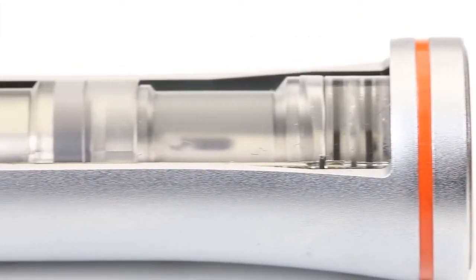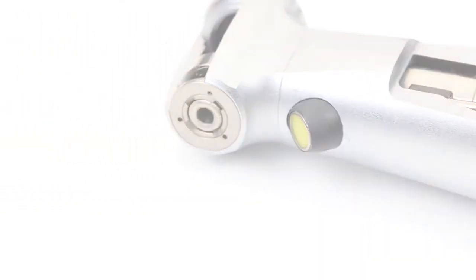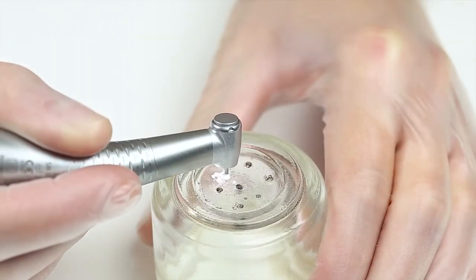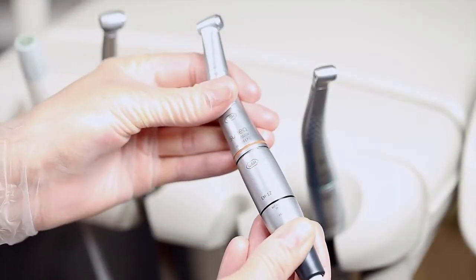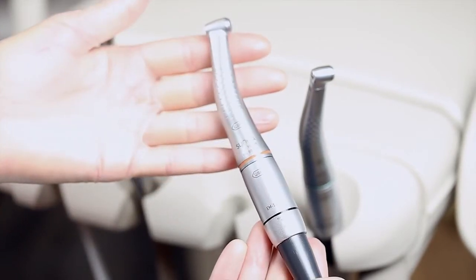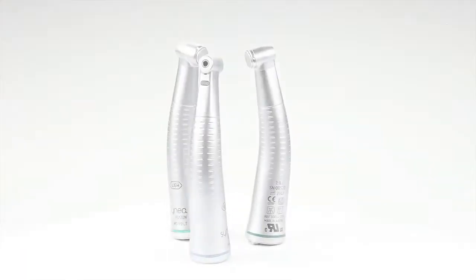In comparison, high-speed contra-angle handpieces can be adjusted within a speed range of approximately 10,000 to 200,000 rpm. They always have enough power, and their operating noise is at least less unpleasant. These contra-angle handpieces must be powered with an electric motor. The entire system is therefore heavier and more costly than an air-driven system.